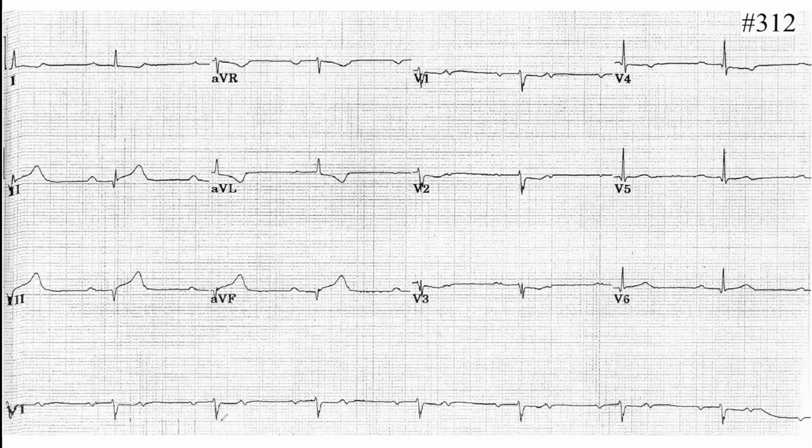And then we look at P wave. In lead 2, it's positive, and in AVR, it's negative. So it's sinus. And then are all the P's followed by a QRS? Are you sure? No, I'm asking myself. So you are very confident with your knowledge. Yes, of course, I'm very good with myself. Yes, I believe all the P's that I see are followed.